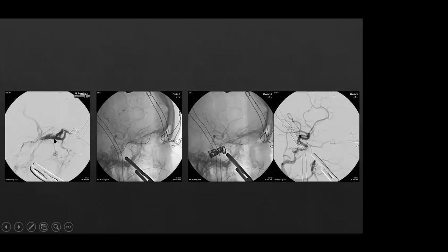You can see that this is a cavernous sinus over here with the reflux into the cortical veins, the reflux into the inferior and the superior petrosal sinuses over here, and the reflux into the ophthalmic veins. So this patient is not only at a risk of losing the vision because of the ophthalmic complications, but is also at a risk of having a venous hypertension and a brain hemorrhage as a result of that. And then you can plan treatment. So this is a patient who's been treated with sacrifice of the cavernous sinus via a transorbital route with a catheter and coils inserted from the ophthalmic vein.